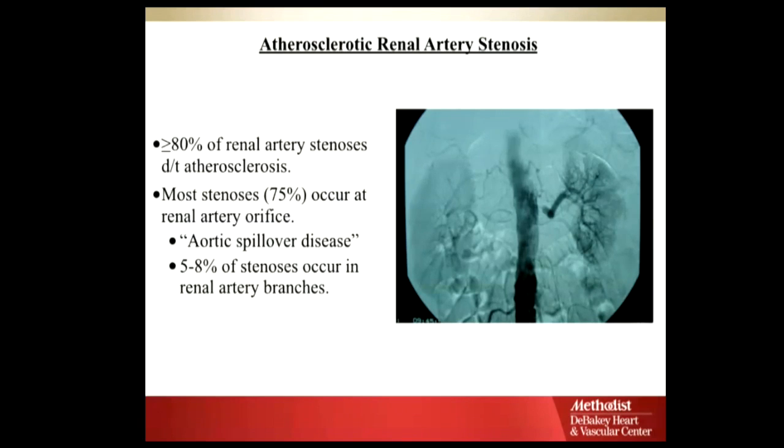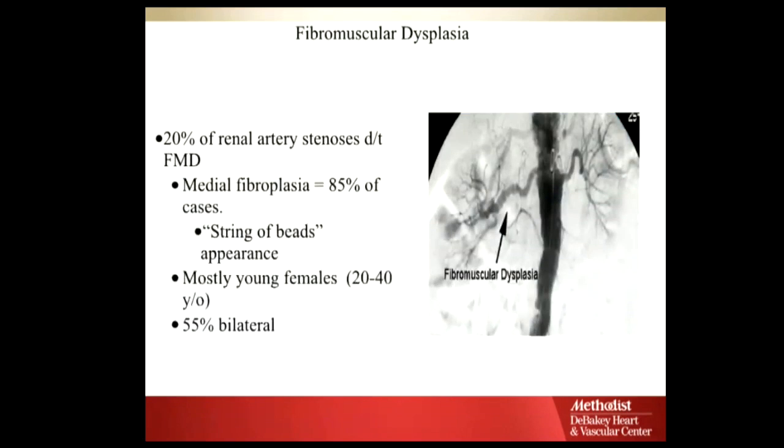So this is one area where renovascular hypertension still has a role. So this is what we call fibromuscular dysplasia. This is the typical appearance of fibromuscular dysplasia, which we call string of beads. Usually in young females, same thing for carotids. You can see the same thing in the carotids. And usually for those, you balloon them. Usually there are some webs on the inside, and you balloon them. So this is actually one area where you can help the patient if they have hypertension, and you treat it, and you could eventually help them.